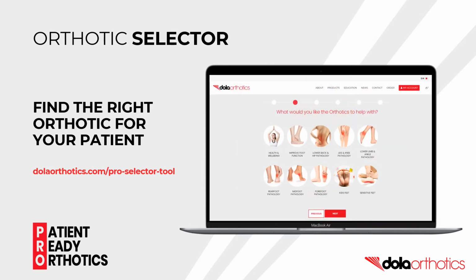What would you like the orthotics to help with? This section allows you to provide the goal of orthotic therapy for your patient. Is it for general health and well-being, to improve function or performance? Does your patient have a pathology, or are they a specialty population, including kids or patients with sensitive feet due to an underlying medical condition?